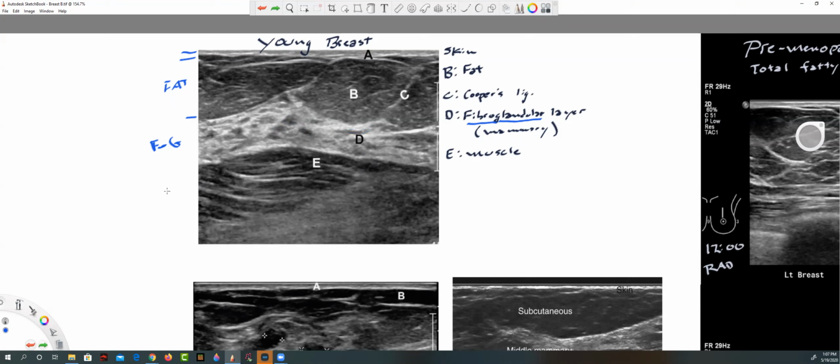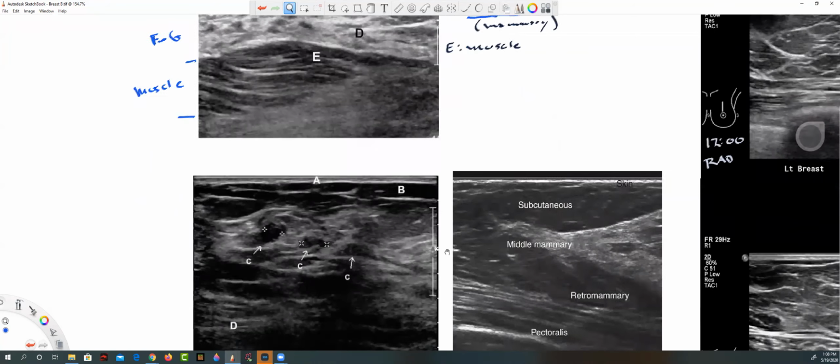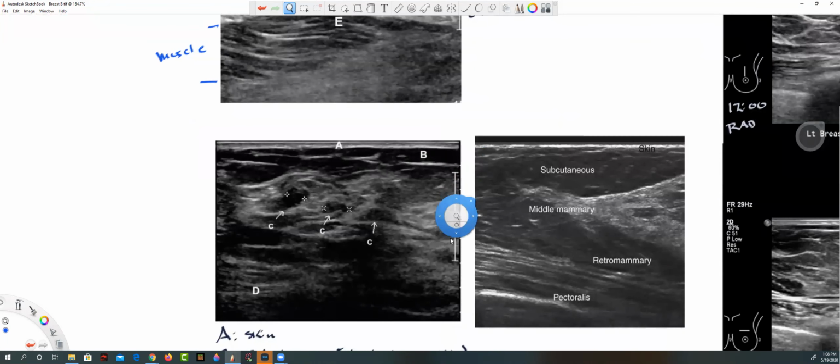And then below that is muscle. That's a decent amount of muscle right there. Once I think about it, that's pectoral muscle, perhaps pectoralis major laying on top of pectoralis minor, but still, that's a good size. This girl works out. You usually don't see that much muscle.